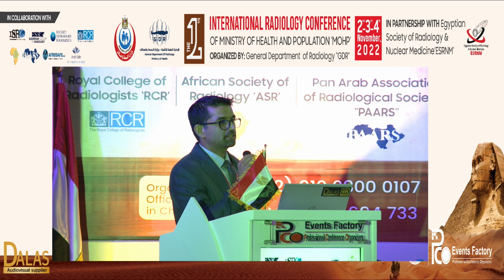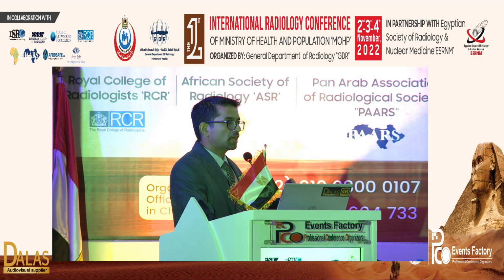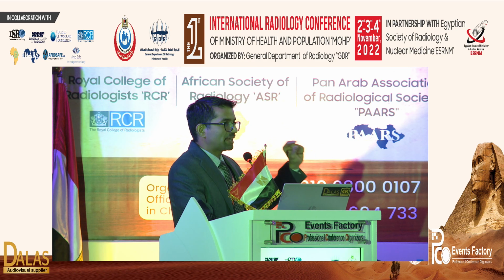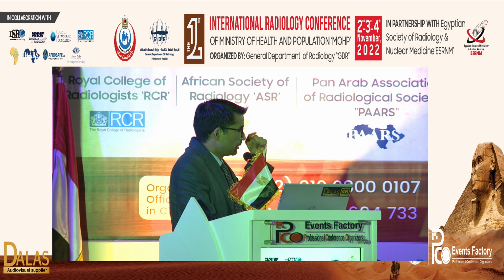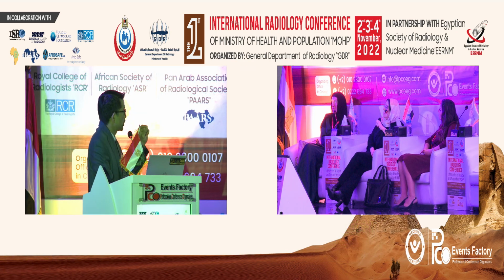I think the key is taking small steps. The most important part is knowing the anatomy and knowing where to look. For example, on every pelvic floor MRI, the first thing I teach my residents is look between the pubic bone and the bladder. Because that's where you will see the retropubic sling every time. So look in that space, look on the sagittal image, look in the coronal image. That's where it's easiest to see.